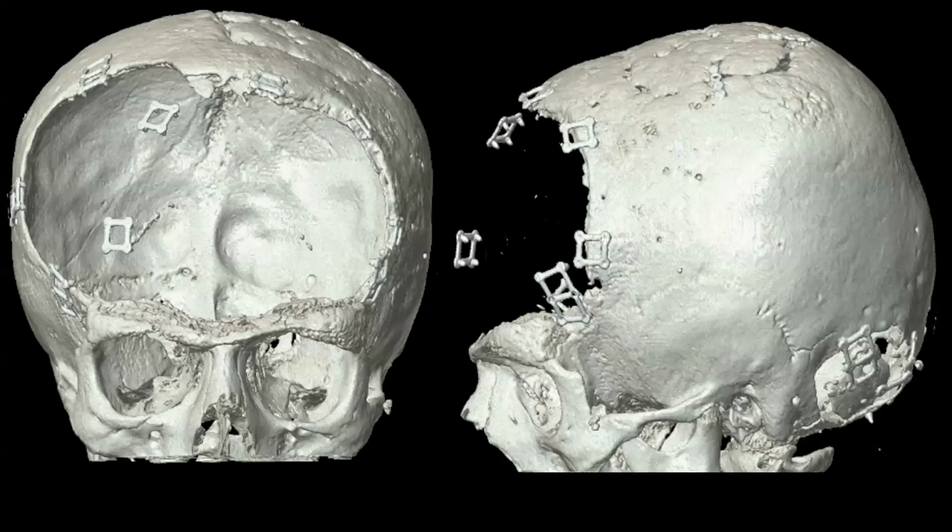For a diagnostic medicine physician, you don't want to see a hole. You don't want to see a temporal lobectomy, a post-temporal lobectomy MRI. It's a hole. They all look the same. But I'm going to show you a post-op CT, and I want you to recreate the story. All right, let's do it.